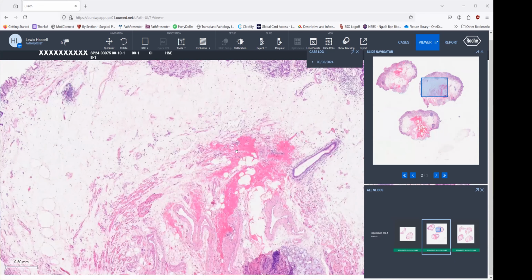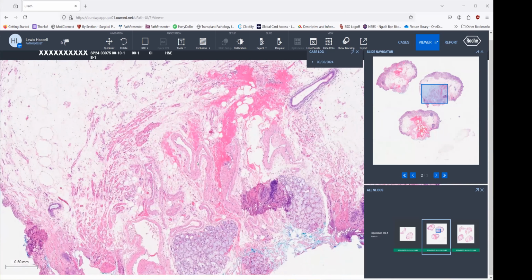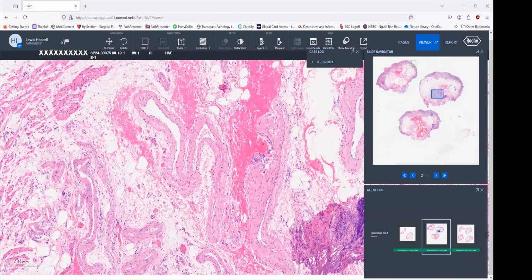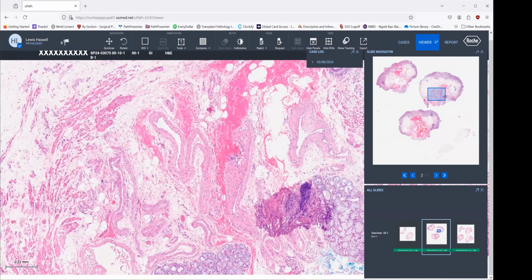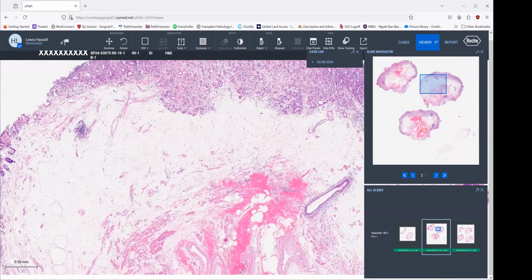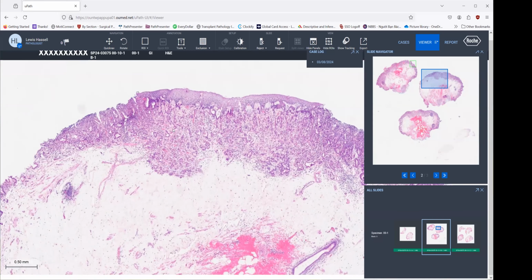And it's helpful to recognize that the reason that the T1B lesions are a greater risk for metastasis is because here they have access to the larger vessels, lymphatics, and so forth that are down in this submucosal space. And that's where you'll see these glands and larger vessels. In contrast, up here, we see only very thin-walled vessels. We see the ducts, but not the submucosal glands. So what else can we learn from this resection?